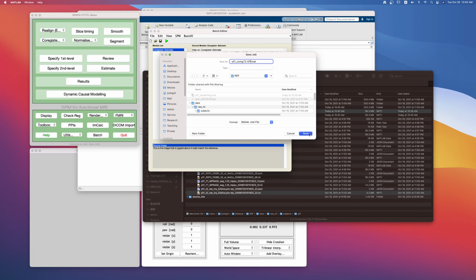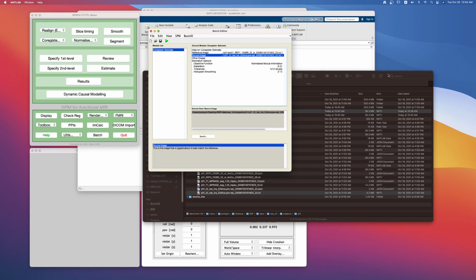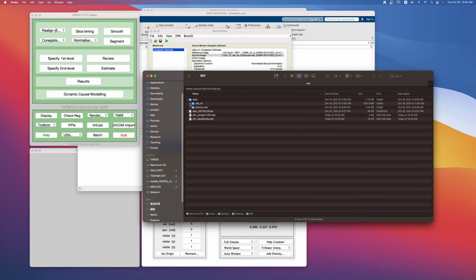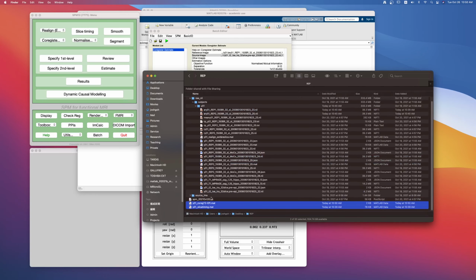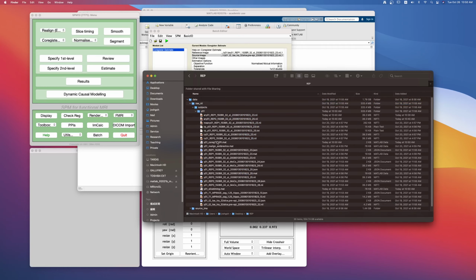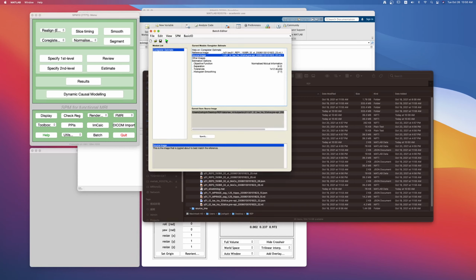I find it helpful to label this detail, because I don't want to get confused. So let me just move my batch files to the correct place, so I don't get confused here. Right? Here we go. So I moved the pre-processing batch here where it wasn't. Sorry about that. Okay. So it's been saved, and here the play button is green.